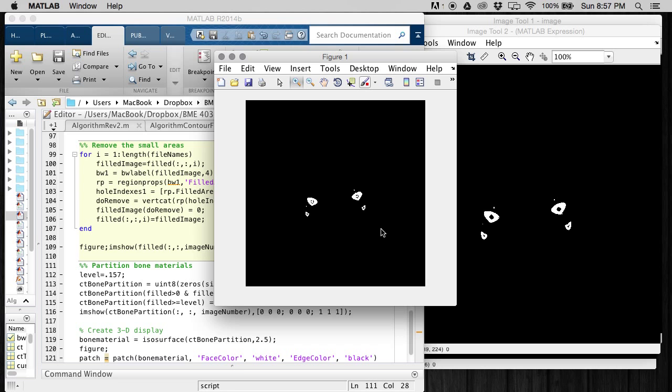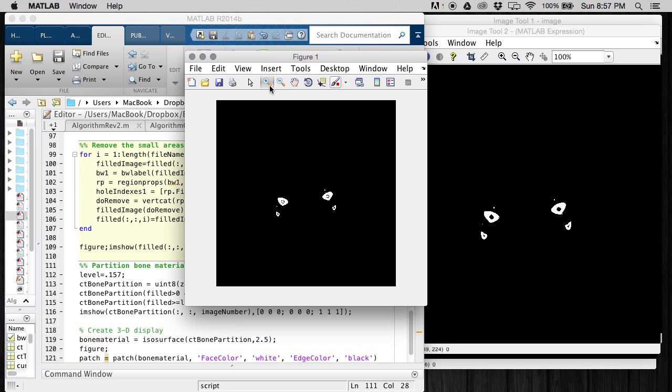So here what we have, it's filled in the contours, but it's actually outlined the filled holes. If it allows me to zoom in here, I'll show you. Sorry, just give me one second. I think it's still processing the second section there, so we might have to wait a minute.